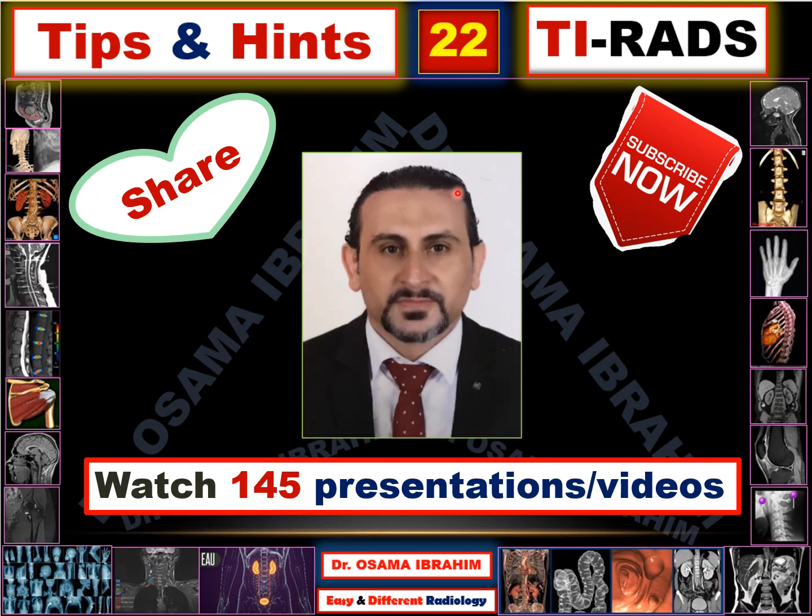At the end, I hope I have provided you with clear knowledge about the basics of how to do the scoring of the TI-RADS.